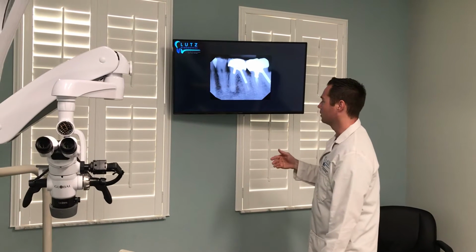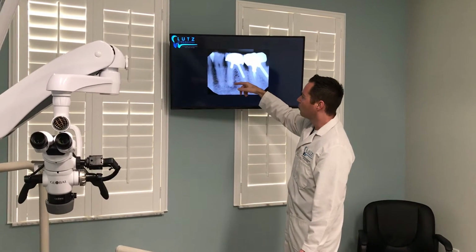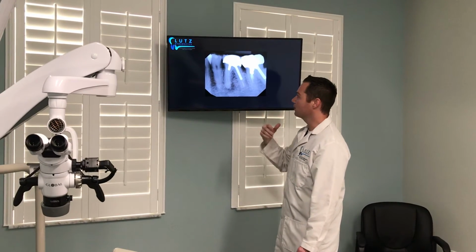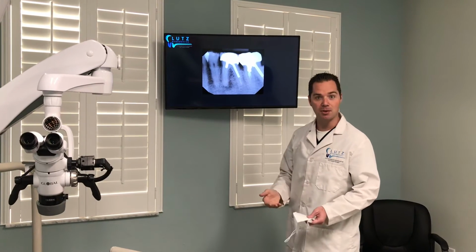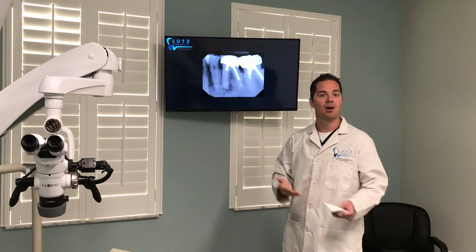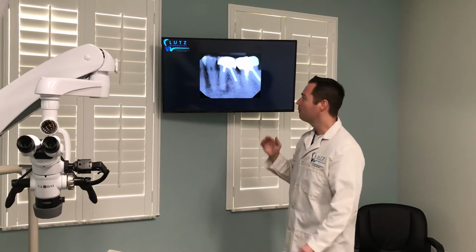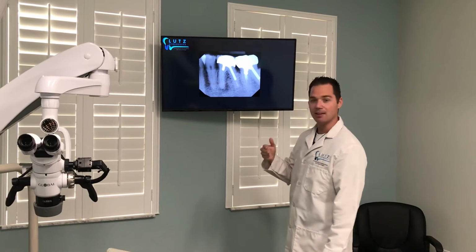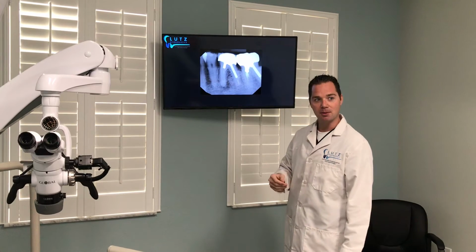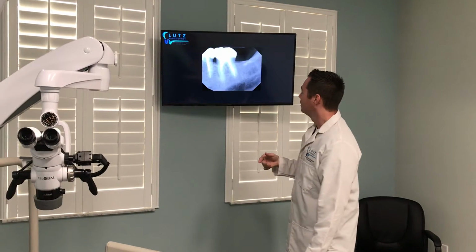It's just a good image that appreciates this is from the beginning, the pre-op X-ray, where you can see the provider, when they did the initial root canal, was not able to get to the end of that root. So one of the considerations is, how comfortable are you at getting to the end of the root? This is all I do every day. But it is something to consider: what is that filling material, and am I able to get to the end of that root, take that material out, and adequately disinfect it. Go ahead and go to the next slide.